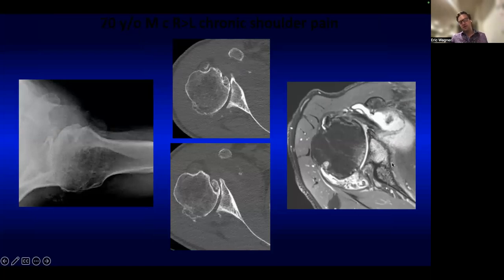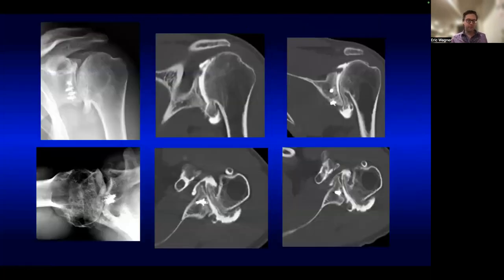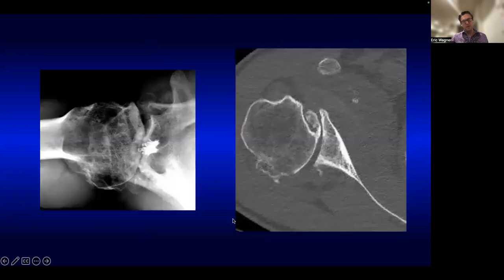And in general, osteoarthritis just looks bad. I mean, there's osteophytes, there's inflamed capsule, it just looks like it hurts a lot. And it does, usually. Here's your goat's beards. So these are the big osteophytes down here. If you see a goat's beard, you know it's osteoarthritis. If you see this posterior subluxation, you also almost always assume it's osteoarthritis. And then once again, another example of it wearing away posteriorly. You can see the value of the CT scan in this case.